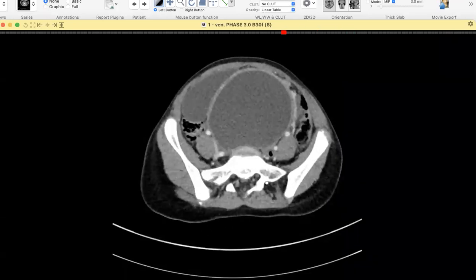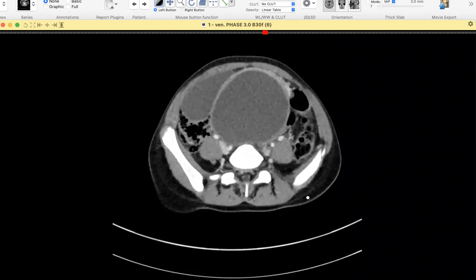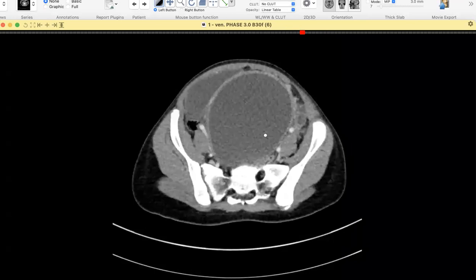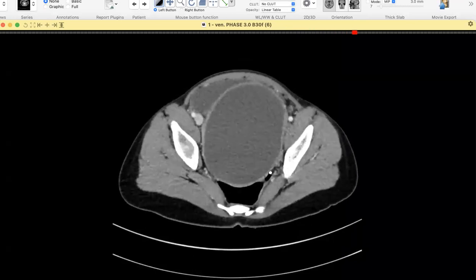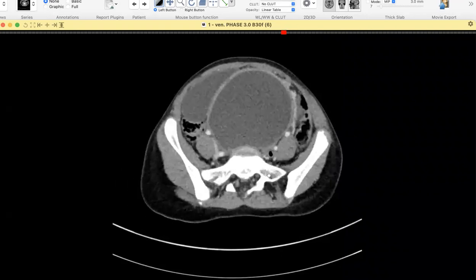It's extending down. This is the left ovary. So the adnexa were normal in this patient, actually. No issue in the adnexa. So all of the central midline structure, of course, it can still be ovarian, but yeah. Okay, thank you. Good case.